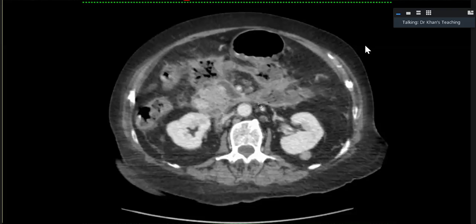Give me your conclusion, then I'll go through the scan. Just give me your conclusion. Okay, there is an abscess seen in the retroperitoneal area with fluid collection. This abscess may be a post-operative abscess or maybe fistulation. Sorry, I didn't hear exactly the history because I was busy about the control. Okay, thank you very much.